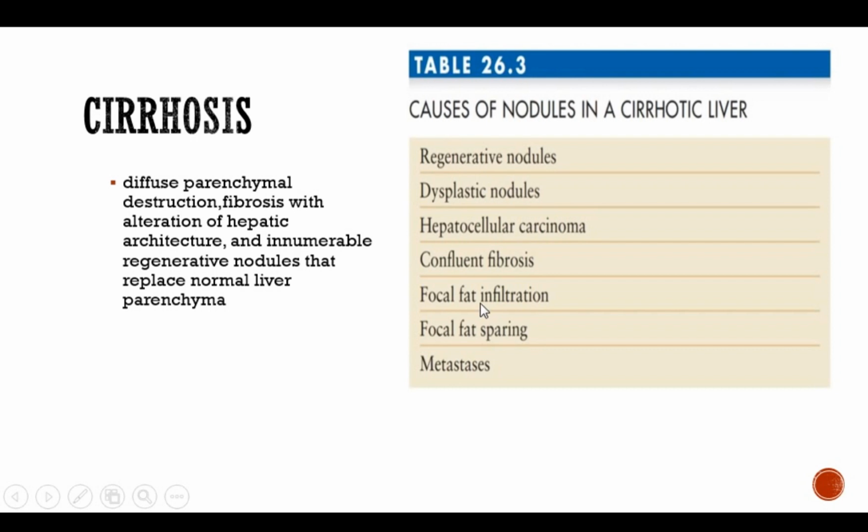Second, even if you have difficulty in diagnosing it, it will appear hyperechoic. What else is very commonly hyperechoic? Hemangioma. Leave it, no big deal. But the focal fat sparing is hypoechoic, and this is a big problem.